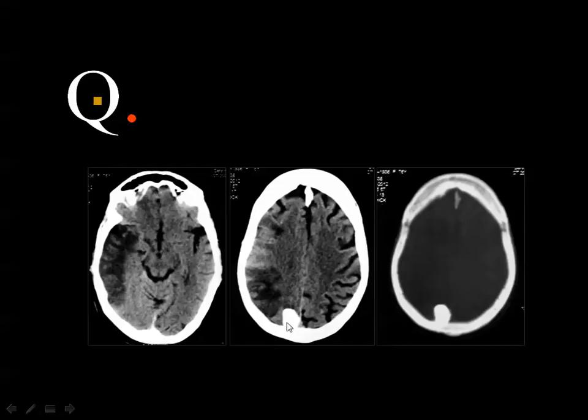Yes, and I said that whenever you see a calcified lesion adherent to the inner skull table, it is calcified meningioma and not an osteoma. Osteoma will arise from the outer table of the skull, very common compared to the inner table. But a calcified meningioma is a common incidental finding, and the patient does not complain of this lesion.